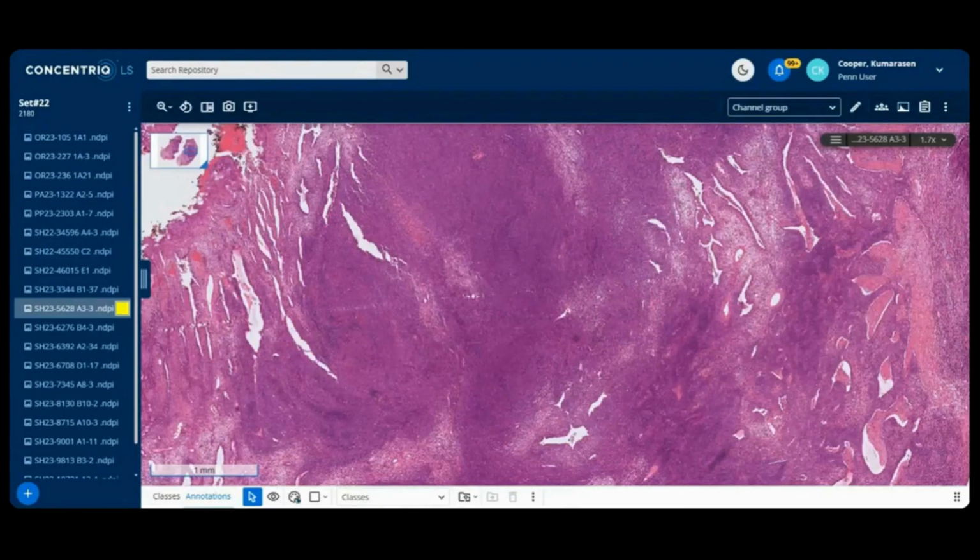And today we will just continue where we left off at the previous conference in December, with the discussion of soft tissue and bone and sometimes head and neck tumors as well. The same theme and method of presentation applies. I will show you an H&E slide along with the history and show you the morphology, and then wait in anticipation for your differential diagnoses, your requests for immunos and comments, and just let the discussion flow from there.